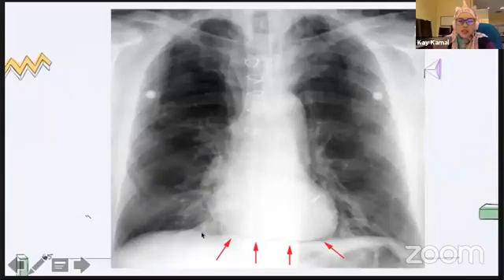What pneumomediastinum means is that they have extraluminal gas within the mediastinum. It can be from the lungs, from the trachea, or the central bronchi, or even the esophagus, or the peritoneal cavity that can creep up and cause a pneumomediastinum.